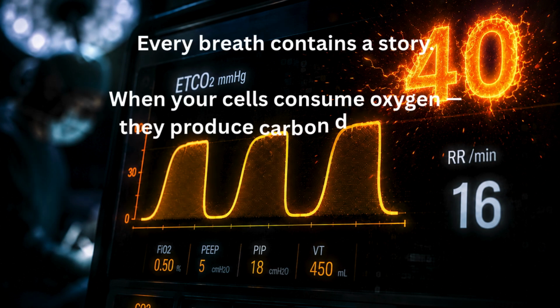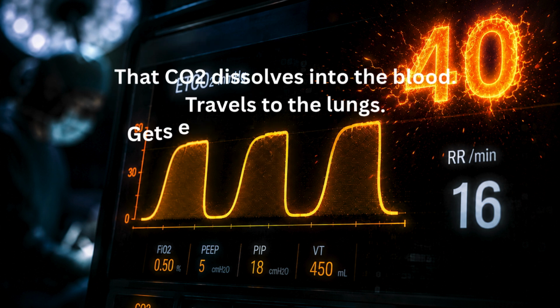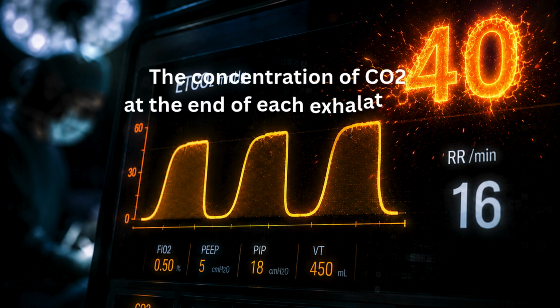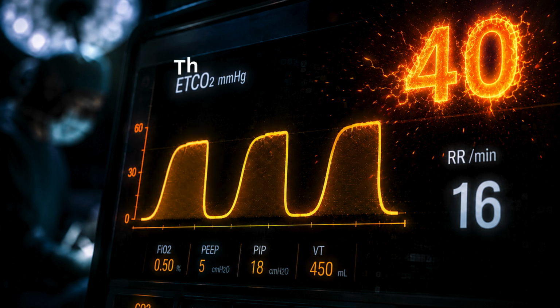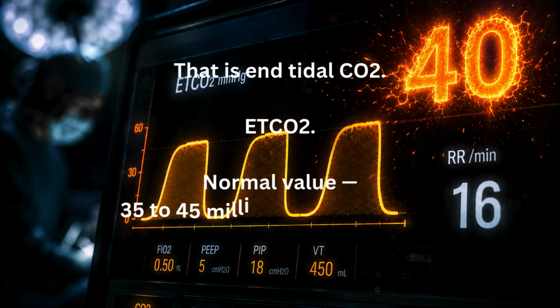When your cells consume oxygen, they produce carbon dioxide as a byproduct. That CO2 dissolves into the blood, travels to the lungs, gets exhaled with every breath. The concentration of CO2 at the end of each exhalation, the very last part of the breath, the part that comes from the deepest, most gas-exchanging parts of the lung, that is end-tidal CO2, ETCO₂. Normal value, 35 to 45 millimeters of mercury.